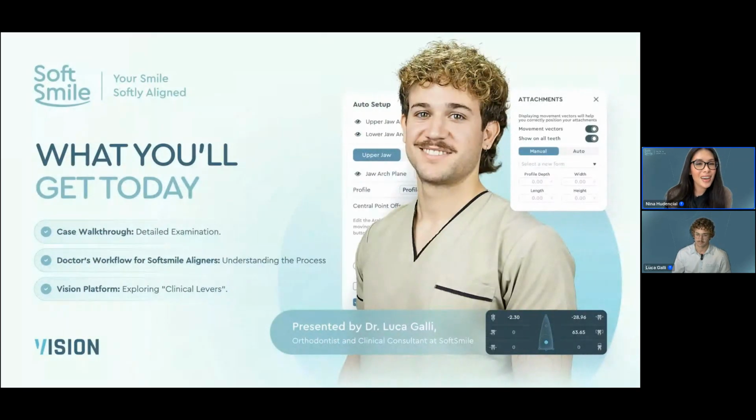We're so pleased to have Dr. Luca Galli, Orthodontist and Clinical Consultant at SoftSmile, with us today. Dr. Galli will walk us through a real patient case and demonstrate how SoftSmile aligners and powerful vision tools can provide better control and treatment planning and ultimately deliver predictable outcomes in more complex scenarios.